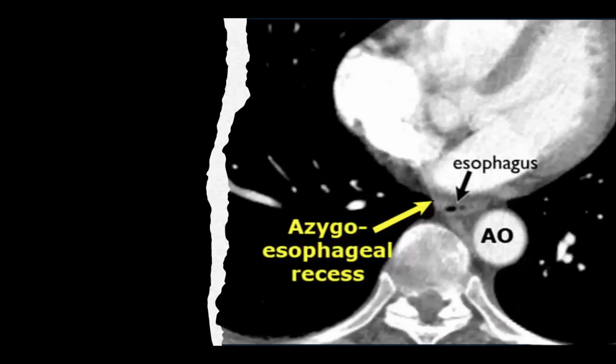It's really called a recess because it is a recess. And this recess is formed by the air-filled normal lung parenchymal tissue. This is the medial aspect of the right lung, precisely the right lower lobe. This is the azygos vein on the lateral aspect with the esophagus. This is the vertebra on the posterior side, and it's bounded anteriorly by the left atrium. So this recess and these structures give the appearance of the line or stripe in the chest radiography.